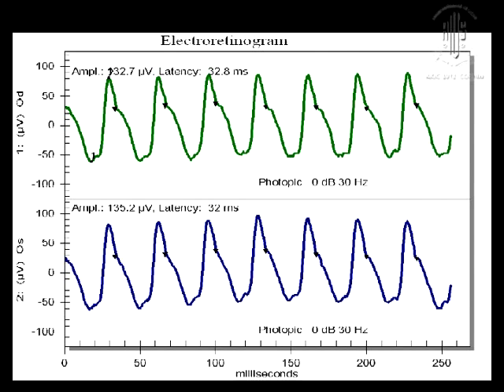So then we have the flicker ERG, which is the 30 hertz flicker. Most of the machines give either a black arrowhead like this or black lines. So on a cursory examination itself, if your peaks are in front of these black arrowheads or black lines, it means that the latency is very good, and hence it's more or less a normal 30 hertz flicker. So that's one way you can rapidly see whether it's normal or abnormal ERG.